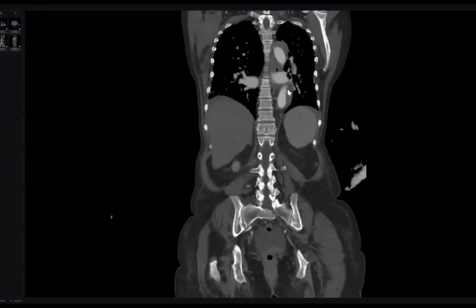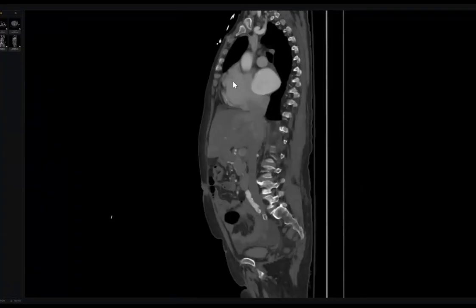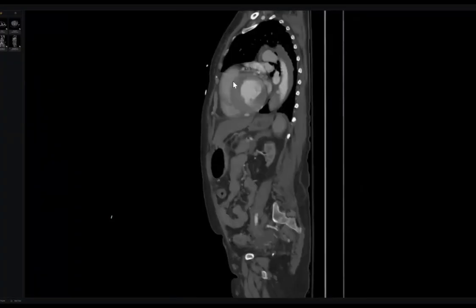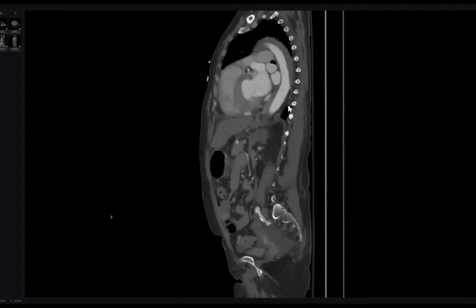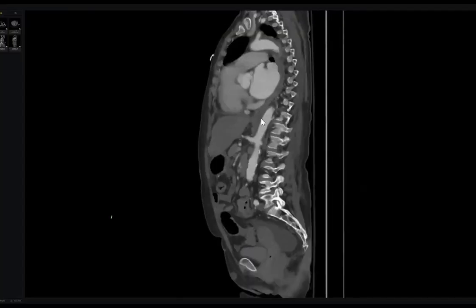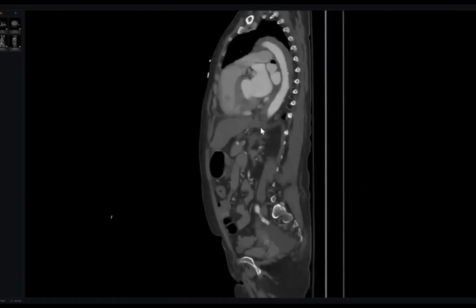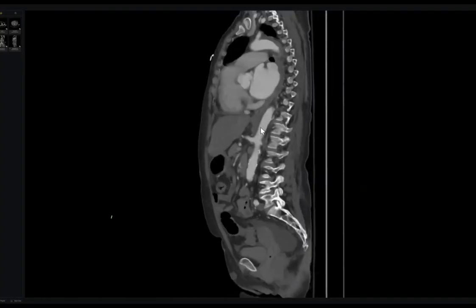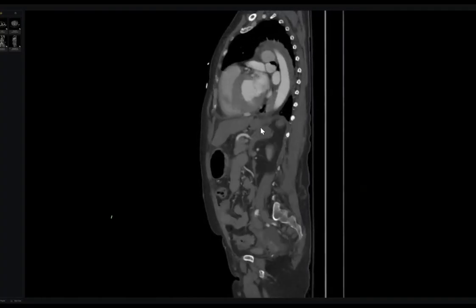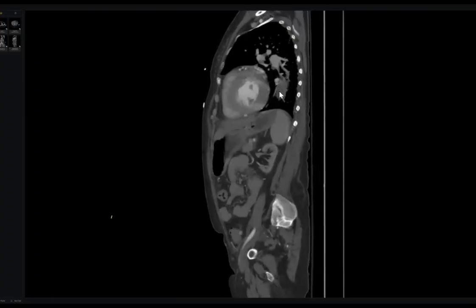And from the penetrating ulcer, the blood goes inside the intima media of the aorta, with only one entry and no exit. Why is this case not considered a dissection? Because you only see the entry of blood, which is the deep penetrating ulcer, this one, and you can't see the exit.